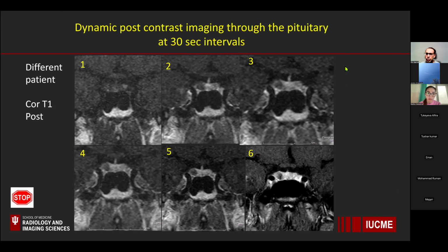So there's a unique technique that we employ, and you may do the same in your protocols when you do MRI of the sella, which is to do dynamic post-contrast imaging through the pituitary at 30-second intervals.